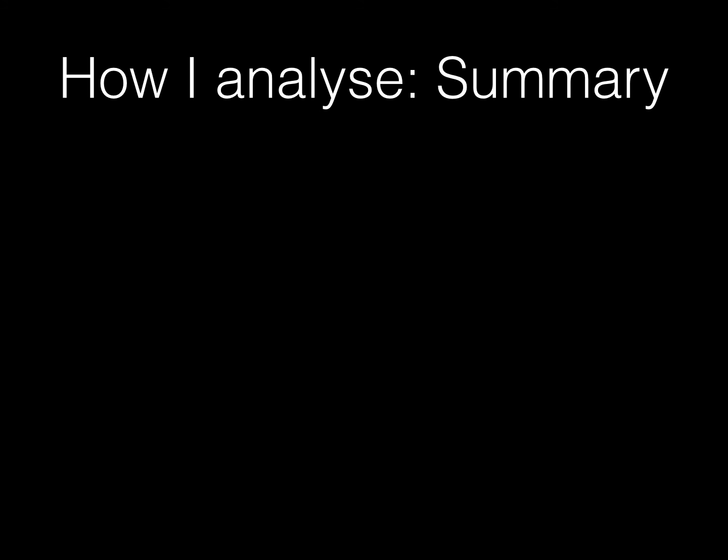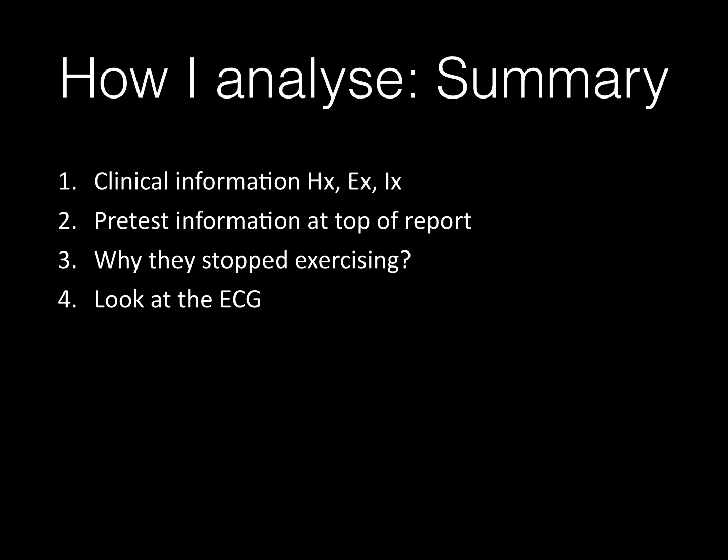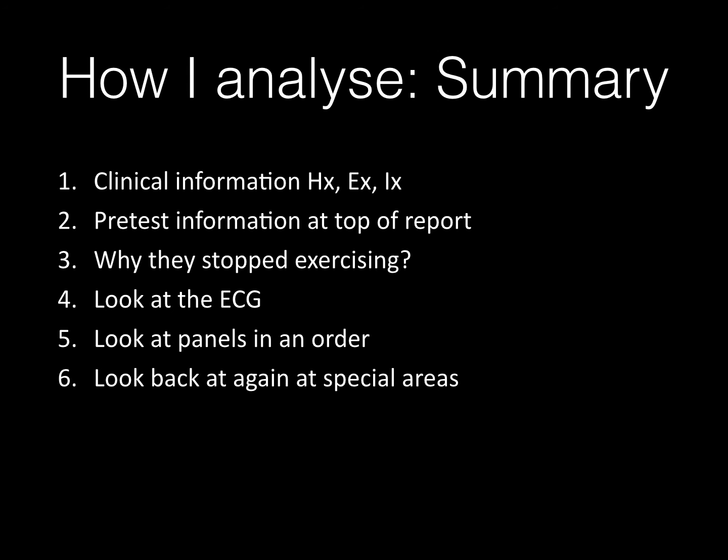I hope you found this small podcast useful. Don't forget, interpreting a cardiopulmonary exercise test is much more than just extracting some information from the panels. We have to think about the clinical information, such as what drugs the patient's on, what is their history, and why are they being tested. What's their hemoglobin? Why did they stop exercising, and did they have any sort of clinical incident, such as chest pain or dysrhythmia? What was the 12-lead ECG like throughout the test? We have to then look at the panels in a sensible order and summarise that information at the bottom of our test report.